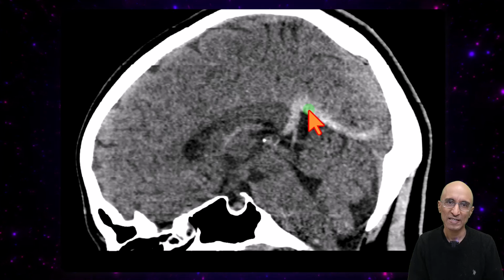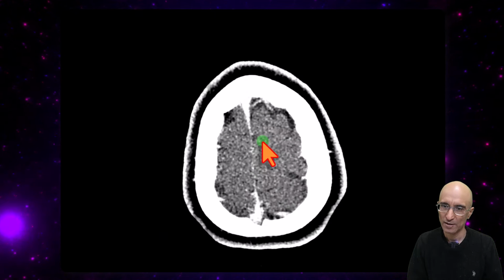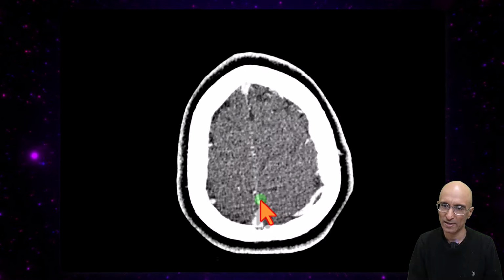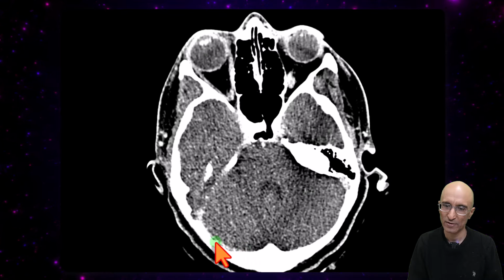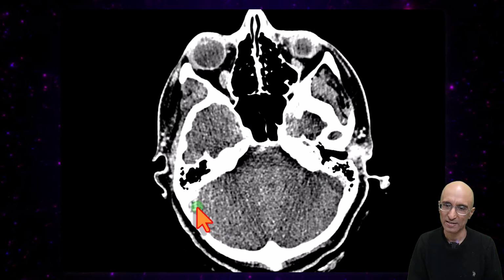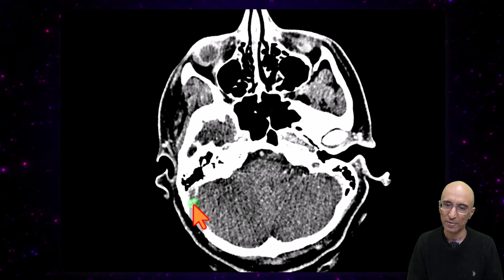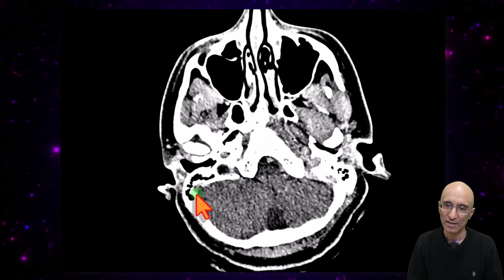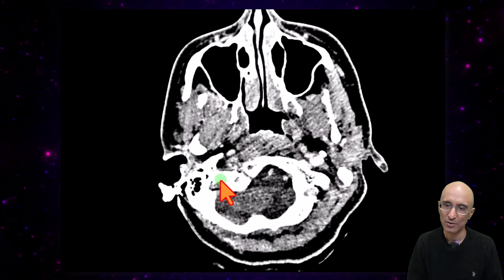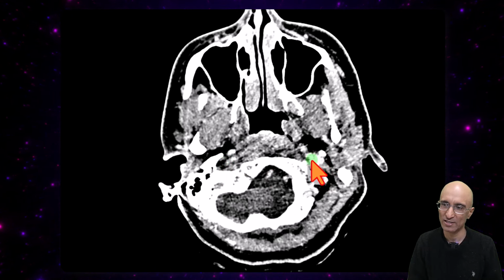The patient underwent CT venogram examination for further assessment. On the CT venogram, the superior sagittal sinus is opacified, and as I scroll down further, we can see decreased opacification of the right transverse sinus and right sigmoid sinus. We can see a filling defect with peripheral hyperenhancement, giving that classic delta sign appearance. The filling defect extends into the right internal jugular vein. We can see a normally opacified left internal jugular vein.